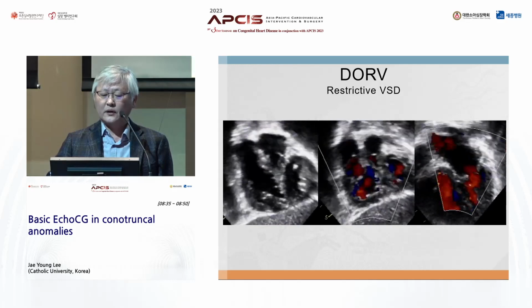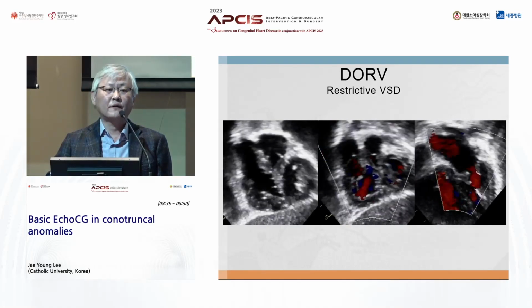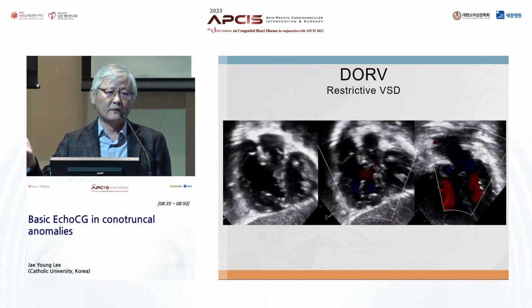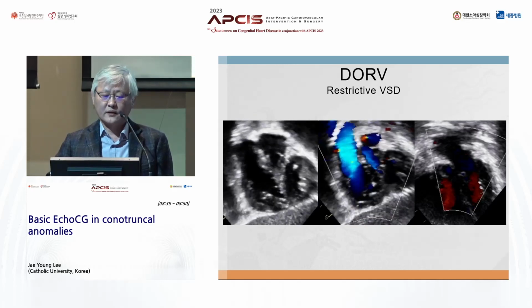And again, in this case, because of the small VSD, LV pressure is very high. So you can notice the white change of papillary muscle, ischemic change of the mitral valve apparatus. So there is some MR. This is a long-term concern in this patient.